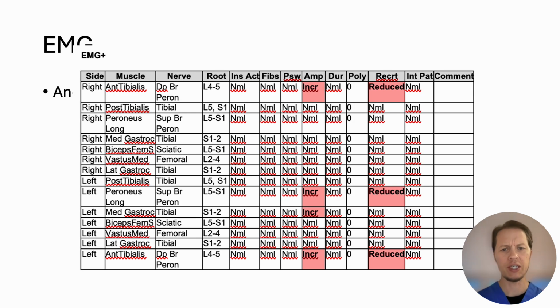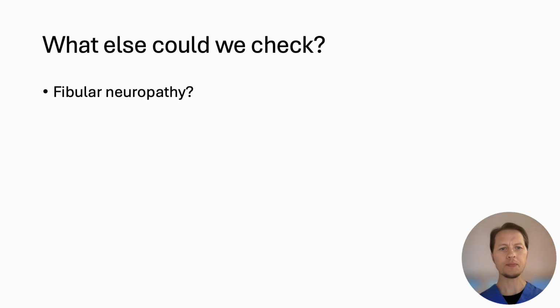And lastly, EMG. This is kind of a meh EMG. We got some neurogenic changes, increased amplitude, signs of reinnervation, so axonal type processes. And yes, I would generally categorize this as being more distal than proximal. No, didn't go into extensive other muscles, and this is something that we talk about in terms of what we could have done better here, and we'll get to that.